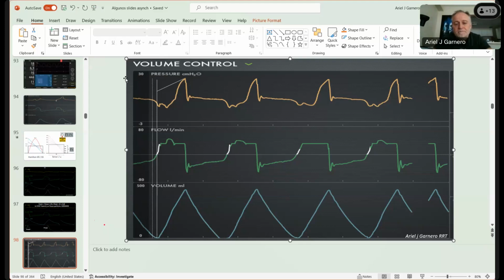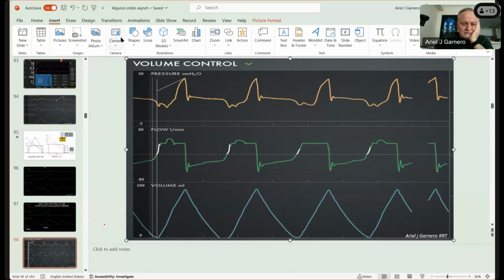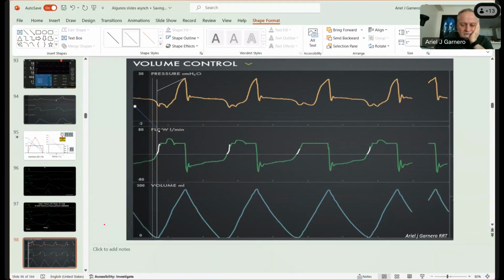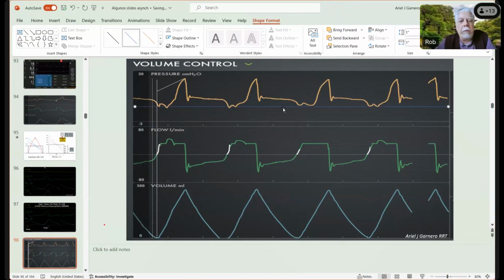That's true. So, what is the PEEP on this level? It looks like the airway pressure is going below PEEP, isn't it? We don't have the settings, but I'm assuming PEEP could be... let me see. Well, if you look at the end expiration, the pressure drops below the pressure at end expiration. So it looks to me like airway pressure is being sucked below PEEP. Yeah. So we would probably call that, on the basis of that, extreme work shifting, right?